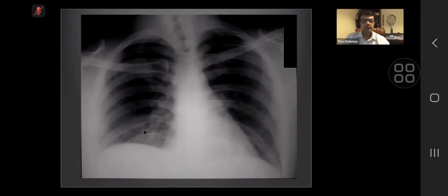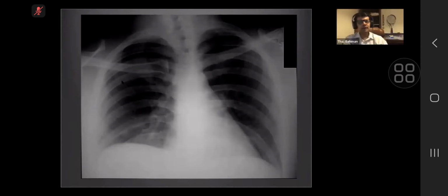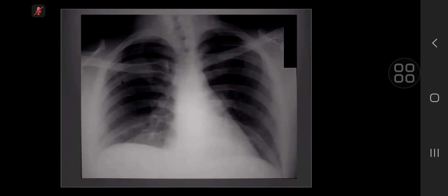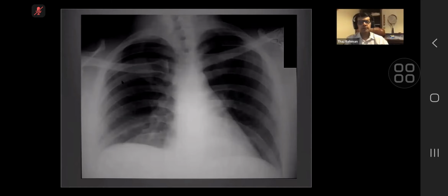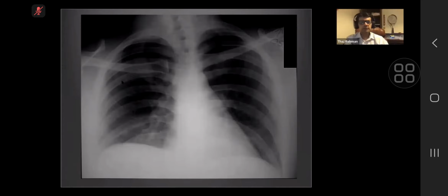That can happen if there is subpulmonic effusion. So if there is subpulmonic effusion, the dome will be elevated, and look for a laterally peaking diaphragm. The previous X-ray was a lateral decubitus to diagnose subpulmonic effusion, but nowadays we don't do lateral decubitus X-rays. Nowadays, what do we do if we want to diagnose subpulmonic effusion? We do a CT. Really? Too much radiation. We could do an ultrasound. Exactly. Much simpler. Just do an ultrasound.